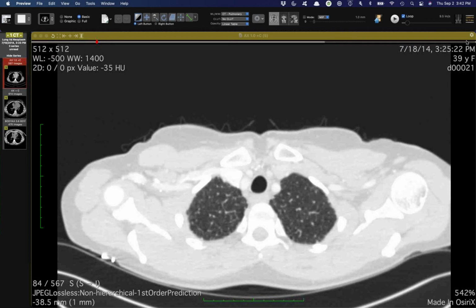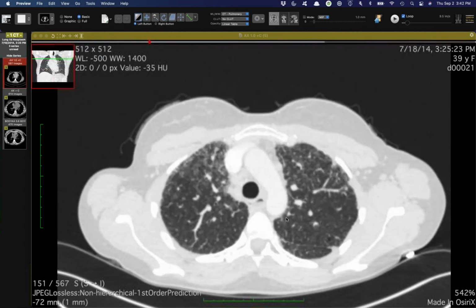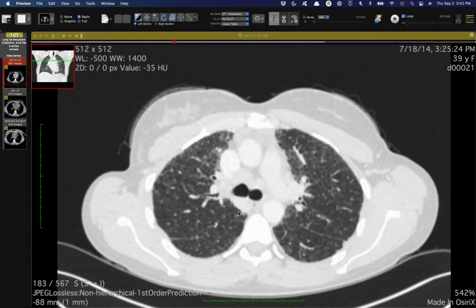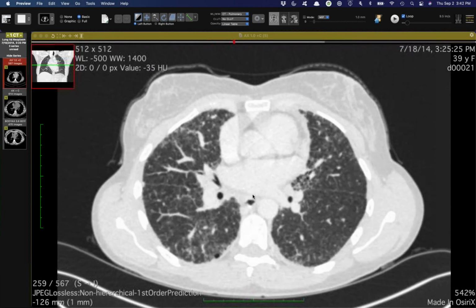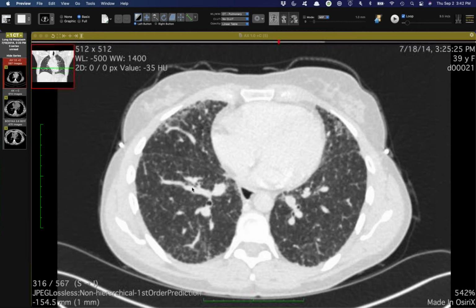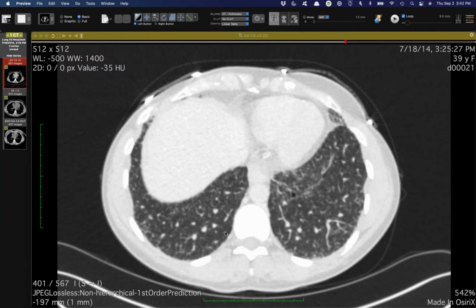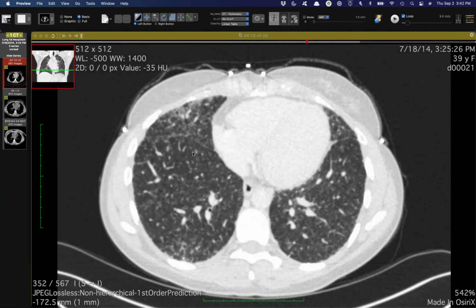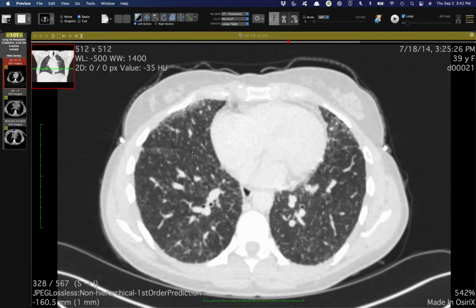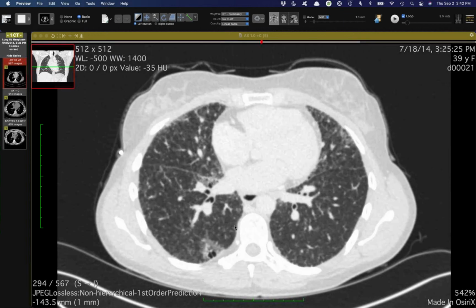Thank you. And then this last case is a nice interstitial lung disease case. This is a 39-year-old woman, and this is a few years ago. She's been transplanted since then. In somebody this young, it's not unsurprising to see a patient that has an unclassifiable pattern of fibrosis. In this case, this is just diffuse reticulation, some ground glass, maybe some traction. It really involves all segments of all lobes, and we'll come back to this finding right here in a moment.